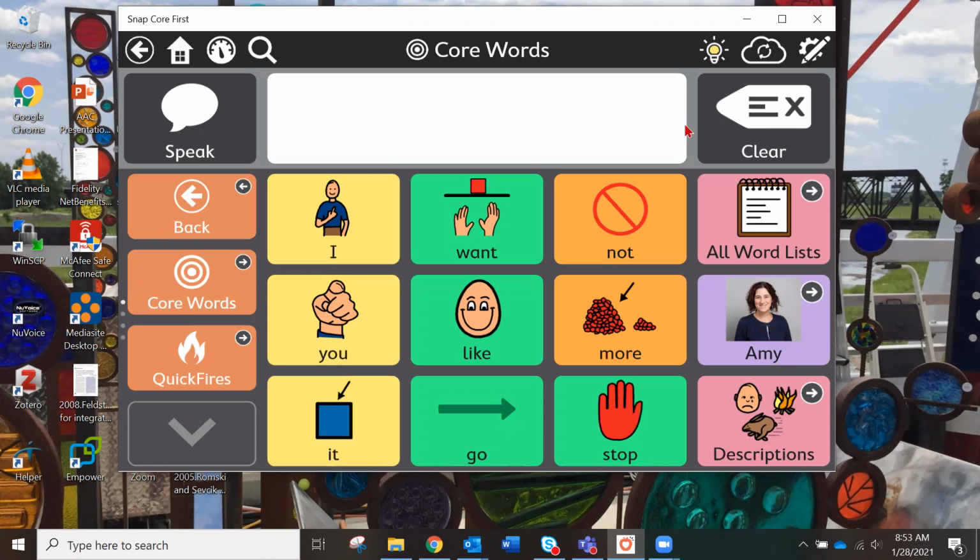This video is going to show you how you can hide and show some keys if you want to really focus in on a certain vocabulary section of the screen, or to work on targeting access or various things. I like to do this mainly to focus attention, not as a long-term strategy. But we'll talk about that as we go through this video.